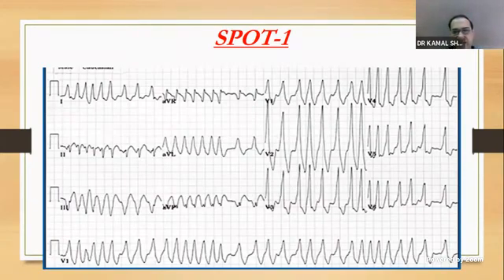So it was roughly said that if the QRSs during the tachycardia are more than 180, you can assume that they are probably because of WPW, but this has not been prospectively proven, because you can have VTs coming from a very distant pathway. The closer a VT is to the septum, the narrower the QRS. If you have a VT coming from an aneurysmally dilated LV free wall, again you can still get a morphology with a very wide QRS.